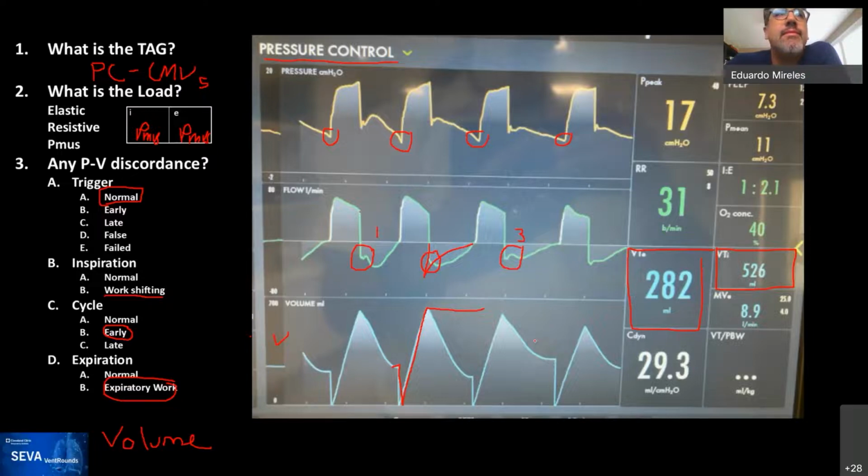So there's one: when the P-plat is okay. So when you're not over this, I mean, especially if you have pressure control, I don't think that the pressure is going to leak. This is more about gas exchange and maintaining the PEEP, right? So if the patient is having appropriate gas exchange, he can have as much leak as they want. That really doesn't matter, and the mode would be exactly. So Imran saying maintain CO2. Absolutely, that's a marker.